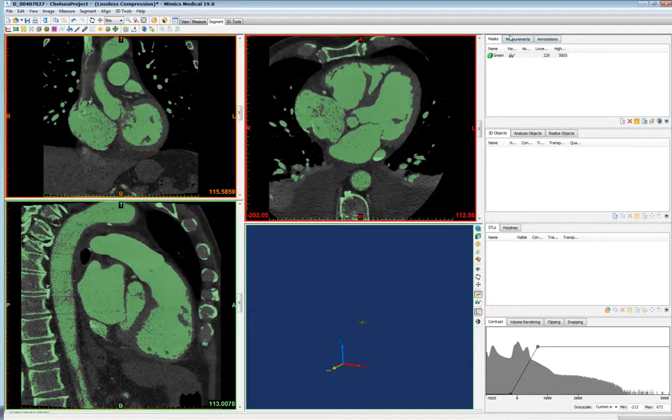And if you notice up here in your mask window, you have your green mask that we just defined. You also can turn your masks on and off, or make them active or not active, by hitting the eyeglasses. So the eyeglasses hides your mask, so therefore you can look at what the original image looks like, and then the mask that you defined on top of that image.